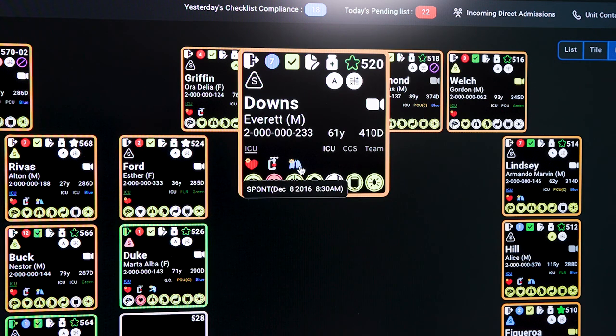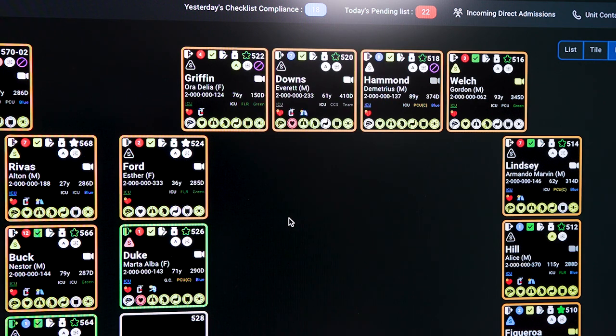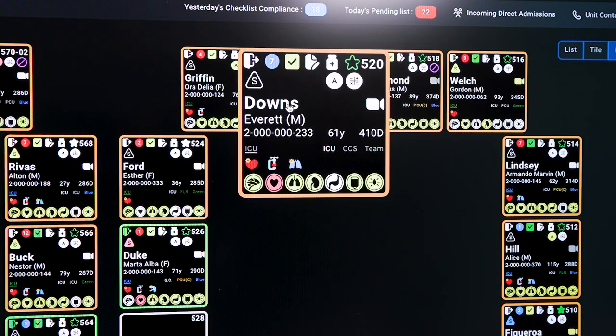So if an organ system is white, for example here, the digestive system, that says that there's nothing wrong. If it's yellow, there's actionable information, which would be trending bad, something you should pay attention to. And if it's red, there's something critically wrong.